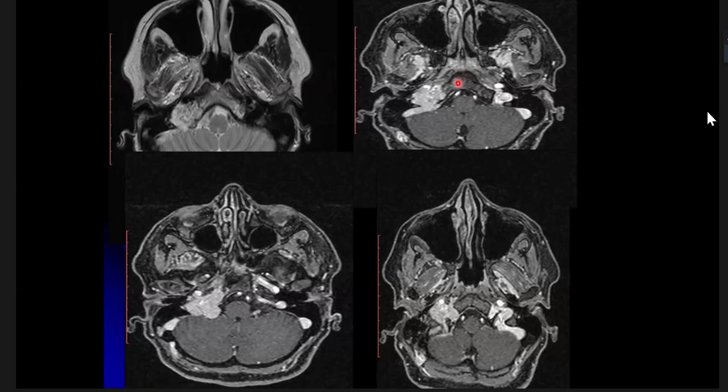meningioma, 3 points related to the destruction of bone, related to the signal, and related to the pattern of the involvement. So only points you have to remember in jugular fossa: signals, enhancement characteristics, how they are growing, and fourth, the bony destruction plus minus. On that 4 points, tell me. First, signal. Sir, it will be iso-intense to gray matter, mostly iso to hyperintense, being a cellular lesion. Next, contrast could be heterogeneous intense enhancement.